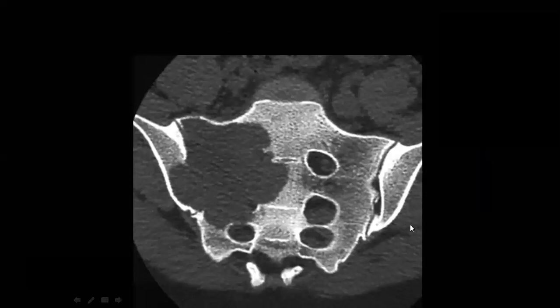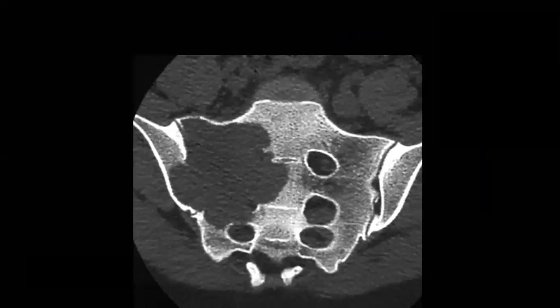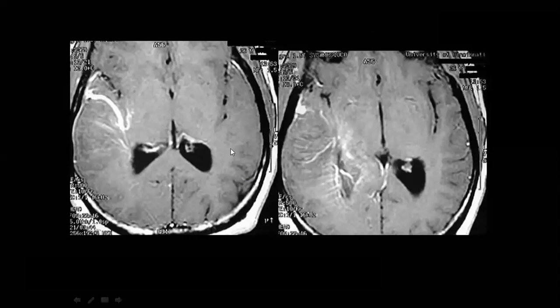One of the good differentials you can put, yes, is giant cell tumor, because it reached the subarticular level. When you find it going to the articular level, don't forget to mention giant cell tumor, and it goes away from the midline. So again, it is a differential, but put it in consideration. Okay.